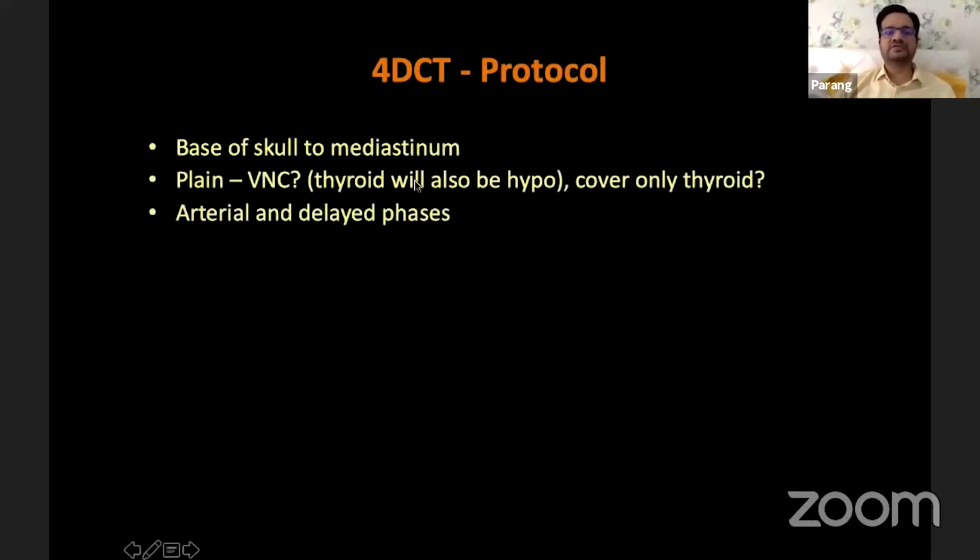So we cover from the base of skull to the mediastinum, because, as we discussed briefly about the embryology, you can have the lesion as high as the angle of mandible in the carotid sheath or as low in the mediastinum. And then we do the plain study.